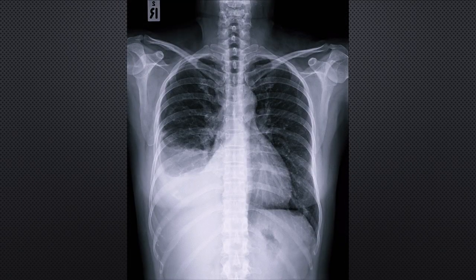On this image, we see a nice example of a right pleural effusion. A pleural effusion is abnormal fluid in the space between the lung and the rib cage. You'll notice that on the left we see a normal appearing costophrenic angle, and we see normal lung markings in the left lower lung zone. However, on the right, the diaphragm contour is completely absent, the costophrenic angle is absent, and there is abnormal density asymmetrical over the lower lung zone.